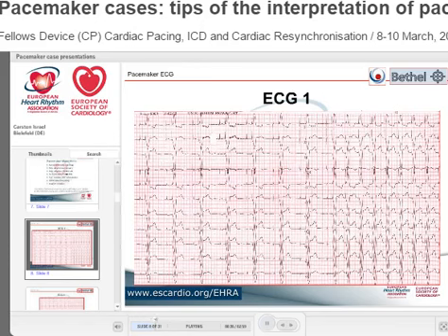So the interesting point is what happens between here and here, or what is the arrhythmia, the tachycardia at the end?